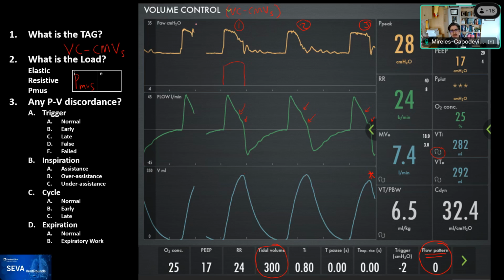And humor me for a second, okay? Just as the fellows and team that are listening. For a second, pause your brain activity and think about the following. The waveform in number 1, the peak looks higher and then the end pressure is lower, okay?